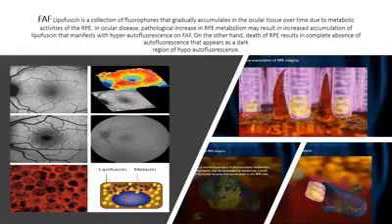When we look at normal fundus autofluorescence, like in this image or this image below, the areas that usually appear black, like the macula, the optic nerve, and the retinal vessels, appear black because there is no lipofuscin there, okay? Also, we get a masking effect from the xanthophyll pigment over the macula. So when I look at the fundus autofluorescence, I will not see any area of hyperautofluorescence.